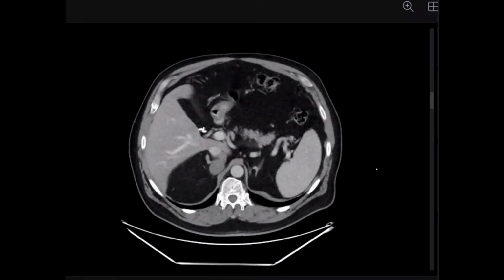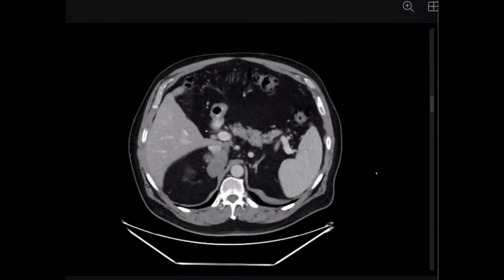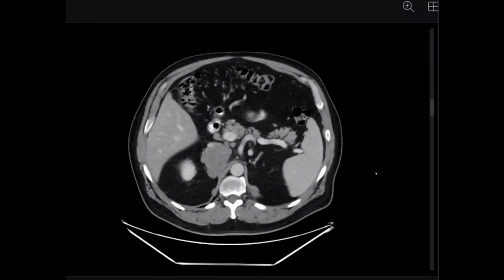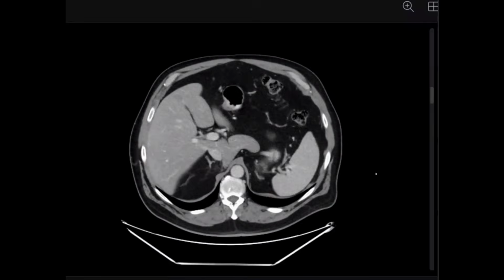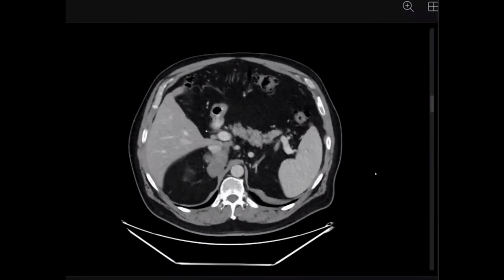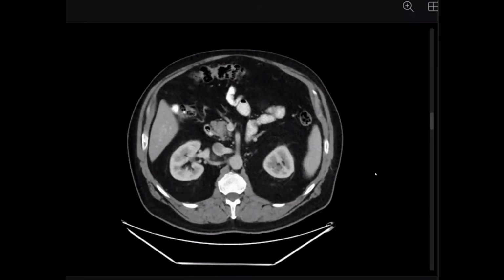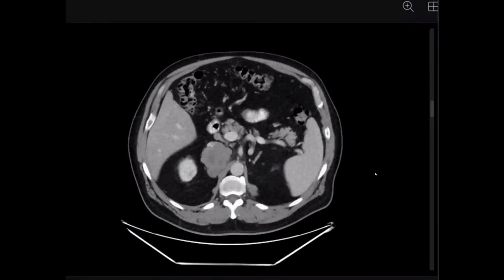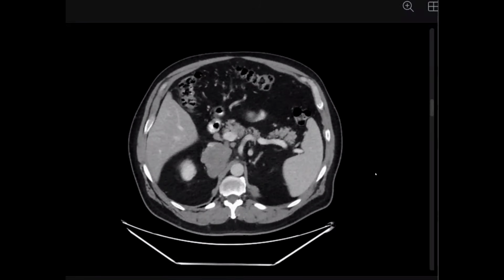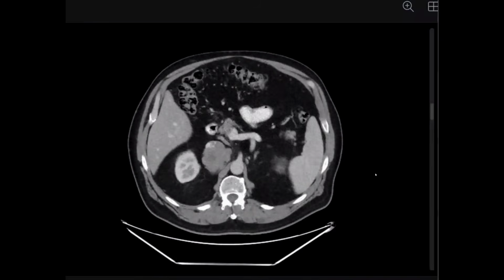Here, the origin I cannot assess because the adrenal is normal, and it could be related to the diaphragm or a soft tissue mass, because it's closely abutting the right crus of the diaphragm. Or any vascular origin, I'm not sure, but it could be if it's invading the IVC. If it is of vascular origin, what type of tumor is this? Sir, angiosarcoma can be. It's okay. If it is vascular in origin, let us finish this case.